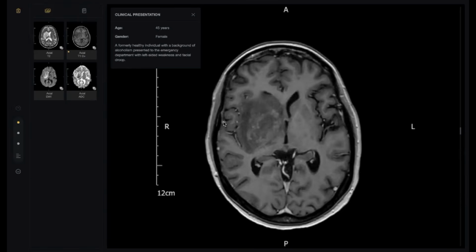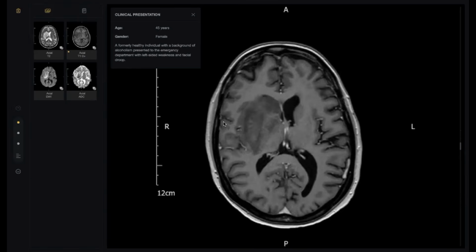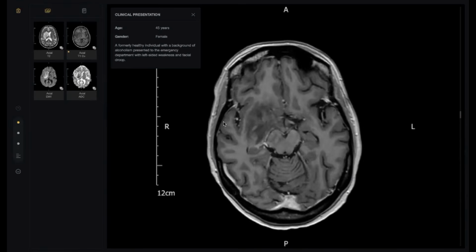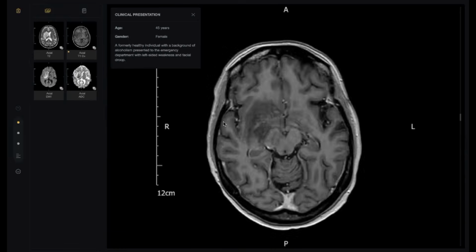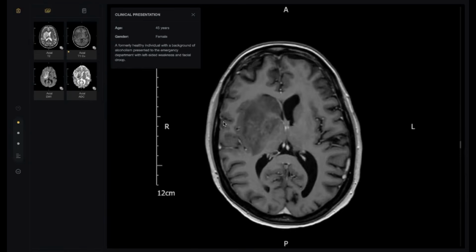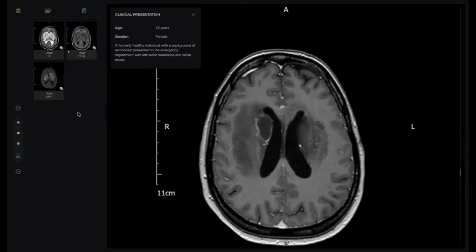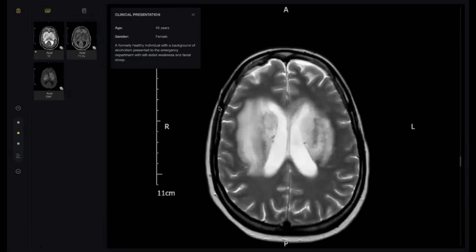This is the post contrast. So what do you think? Just faint enhancement in post contrast phases. However, I would like to compare it with the T1 to see how the lesion looks. Actually, the patient after 9 days repeated the MRI due to severe deterioration.